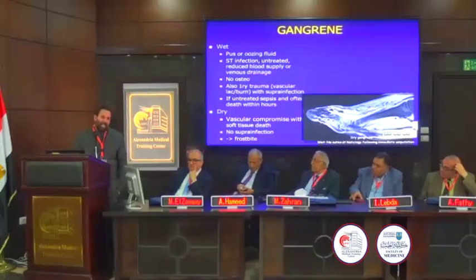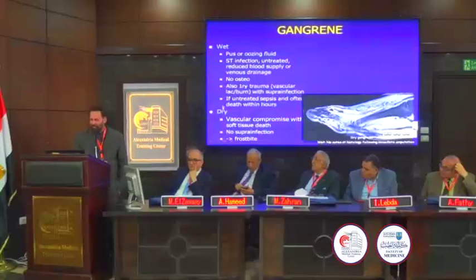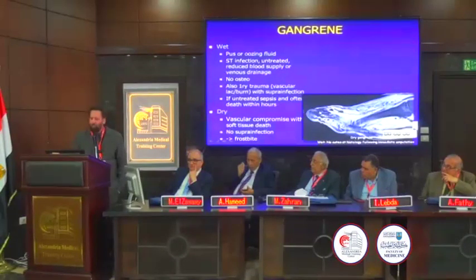So the nice thing is I have proof that it wasn't, because they amputated the foot. And I read it the next day and I said, aren't these little lobules of gas? Can you see the little lobules of gas on MR? And you see how it enhances here, and then nothing is enhancing distally. So this was wet gangrene, no osteo and histology.